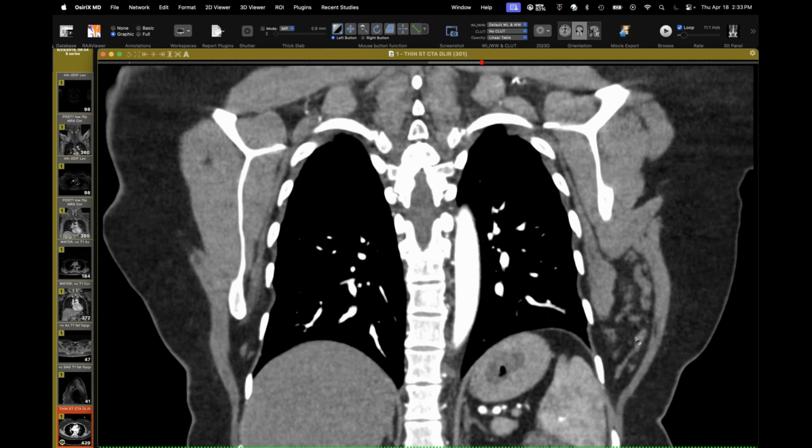Yeah, I don't know if there's some proliferation. I don't know enough about these anymore. The names keep changing. If there's some genetic driver to these, this one is not part of a syndrome. There are some that can be, like Maffucci syndrome. You can get them associated with a bunch of enchondromas in the bones. And then there are some of these other named syndromes associated like that with different types of vascular malformations. But no, I don't think this has any malignant potential. It doesn't need to be resected or anything like that.